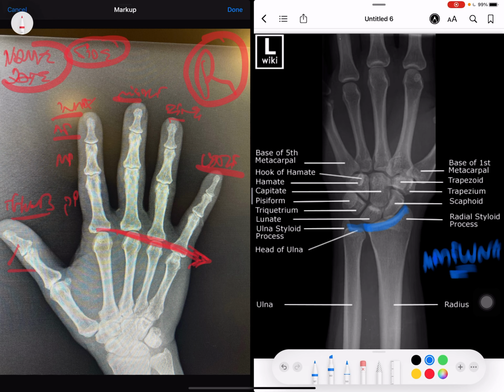And it's a defect, and you get an ulnar minus or an ulnar plus, depending whether it's riding up or down, depending on the radius function. Also, all radius fractures will mess up this angle and the slope. So anyway, watch for the slope. Most of the time with the boxer fracture, when the fifth is abnormal, it'll always be down. This will be sitting here, and you know the slope is gone.